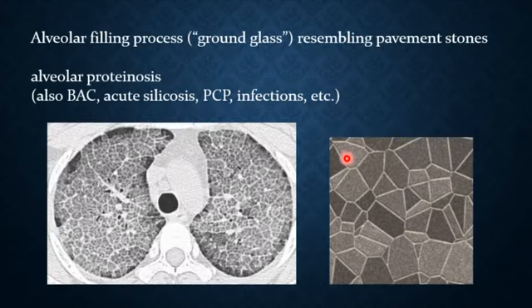Okay, what do we mean by crazy paving? Crazy paving is the thing that they make the street with. You see this, like you see in the Citadel, the ground. This is the crazy paving. It looks exactly the same. You see the resemblance.